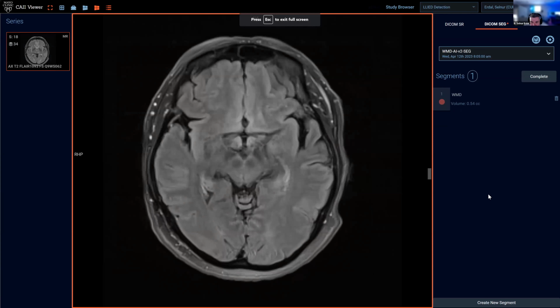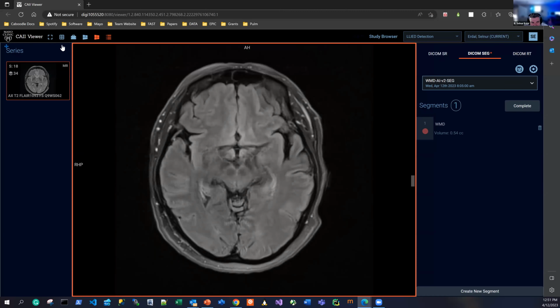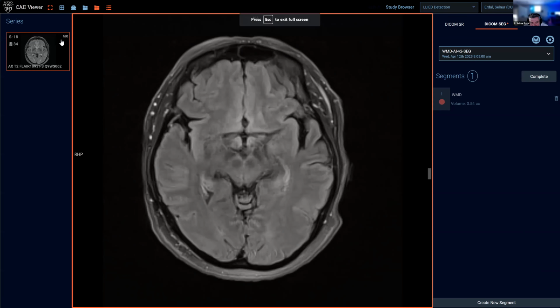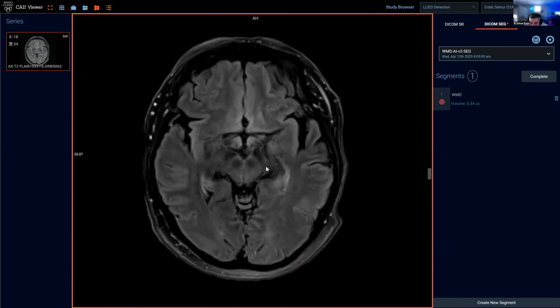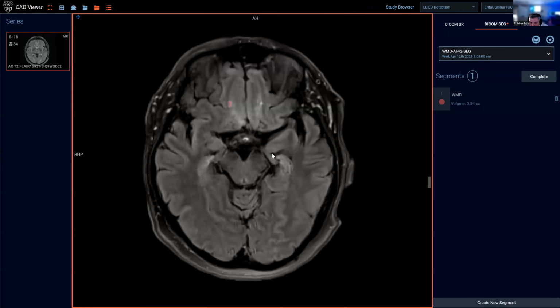And when we built our interfaces, we were making sure, for example, when I turn this from web browser to a full screen mode, this top layer is matching with our clinical viewer's top layers. So if the user moved their mouse from left to right, if they did any kind of windowing leveling, we make sure it totally matches the clinical viewers.